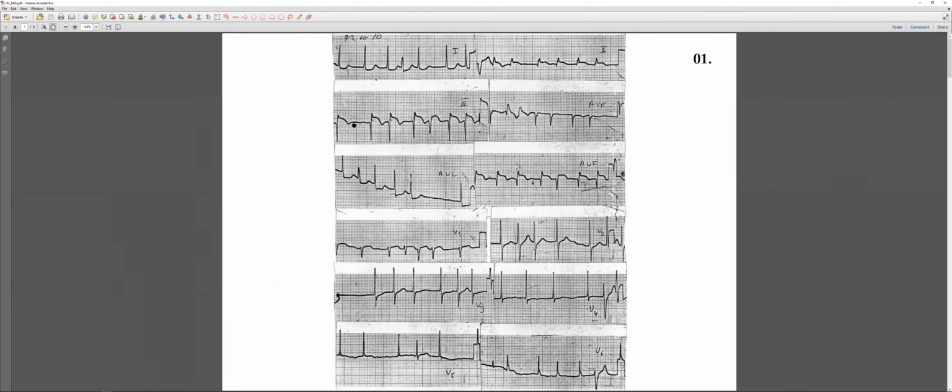Okay. Since there are no P waves, it's either a sinus exit block or the sinus is not forming the impulses at all. Yeah, but if you do have, let's say, SA block or sinus arrest, you still have a normal rhythmicity because the AV junction should fire. The AV junction has taken over, but that's rhythmic and should be slower than this.